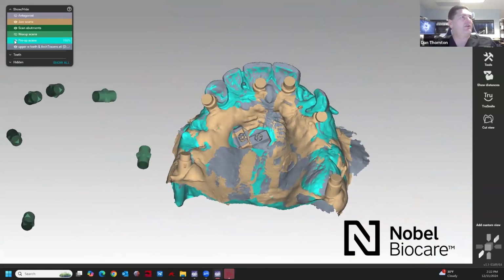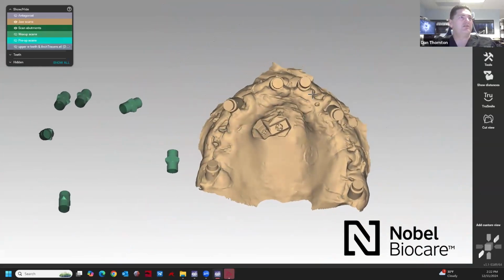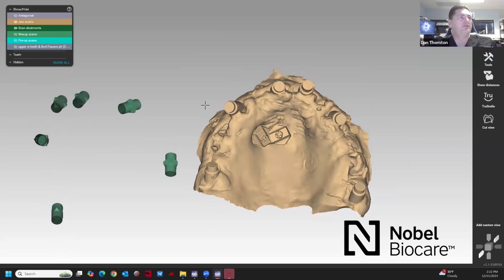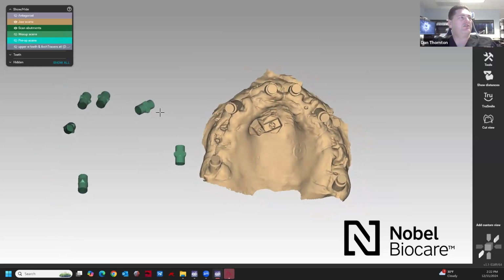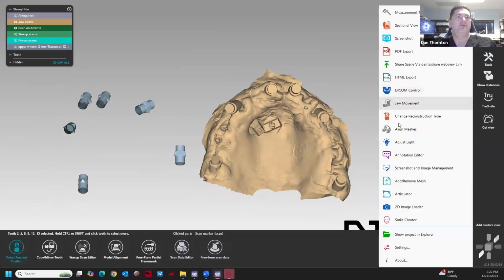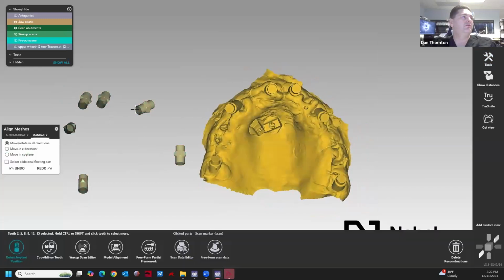So now after that, we can get rid of the pre-op and also the one we brought in for the alignment strategy. This is more of our tissue. I already brought this into the iCam and changed it over to DES. So there's two different ways you can do this. You can bring this in and align these with the scan bodies you already have there.